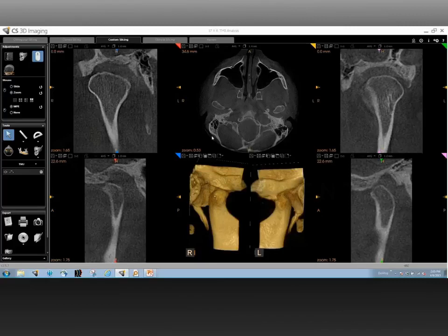Dr. Gattal, you've explained well the normal anatomy. We are looking at a scan from the CS9300 Premium and this is one of 7 different fields of view. This is specifically a 17 by 6. The 17 allows for bilateral anatomy. So could you specifically comment on the bilateral anatomy that you see here on screen?